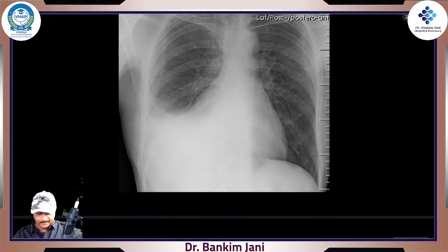Why guess? Here it is. See? Normally the lungs are like this. This is the diaphragm. This is the cardiophrenic angle, the cardiophrenic angle. And this one is the costophrenic angle. This is how the costophrenic angle looks.